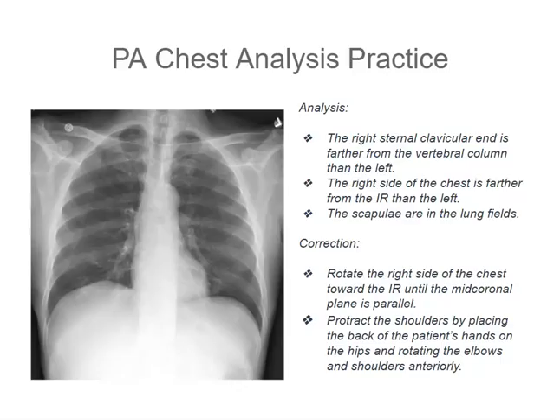In this case, the right sternoclavicular end is demonstrated away from the vertebral column here. So that should indicate to you that the right side of the chest is farther away from the IR. The patient is in a LAO position.